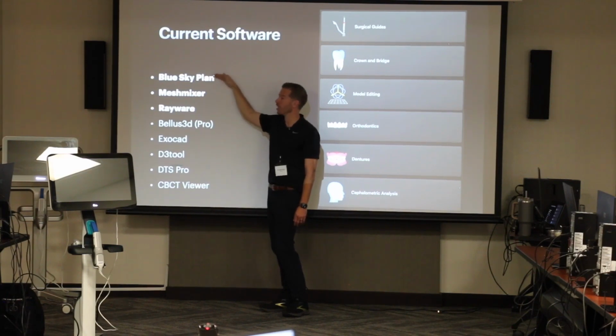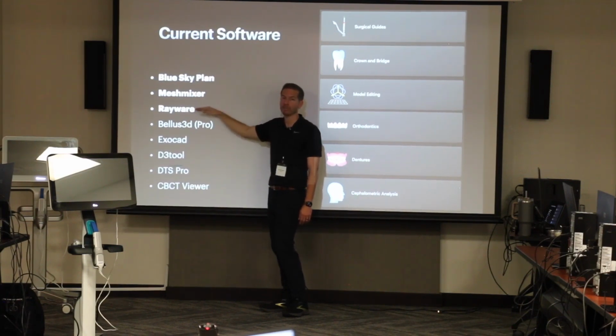This is our design software. This is our output software. So this is how we actually print out of the Sprint Ray.